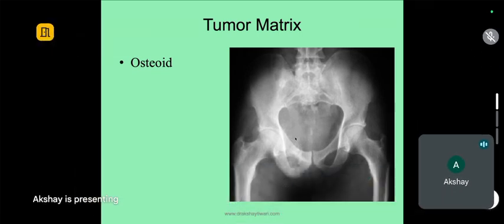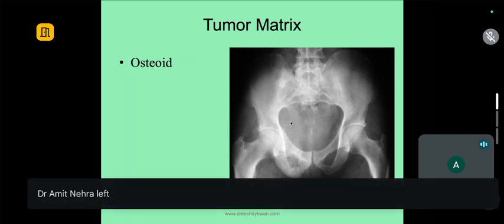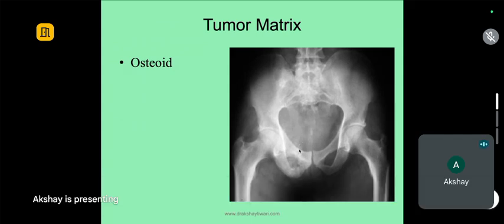Yeah. So this is kind of a cotton wool. You can imagine again, this obturator foramen is showing some cotton wool kind of a pattern. So this is an osteoid matrix, and we know that this is an osteoid forming tumor. We also know that the pattern of destruction is probably permeative. You can see here, it's a very wide zone of transition.